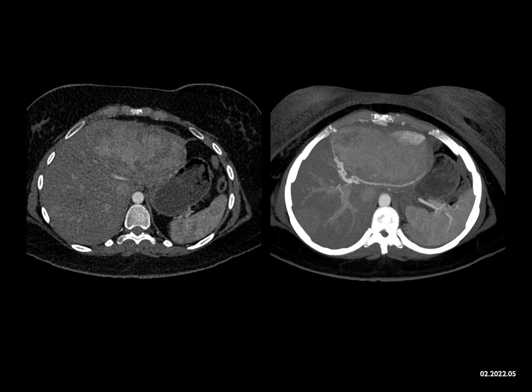And then when you look at the images with MIP, you see the vessels are stretched, you see the vascularity, but you don't see any changes of cirrhosis. I always like to think about hepatoma in cirrhotic livers. You don't need cirrhosis to have a hepatoma, but that makes it more likely. You also don't have the neovascularity you typically associate with hepatoma. So what could this be?